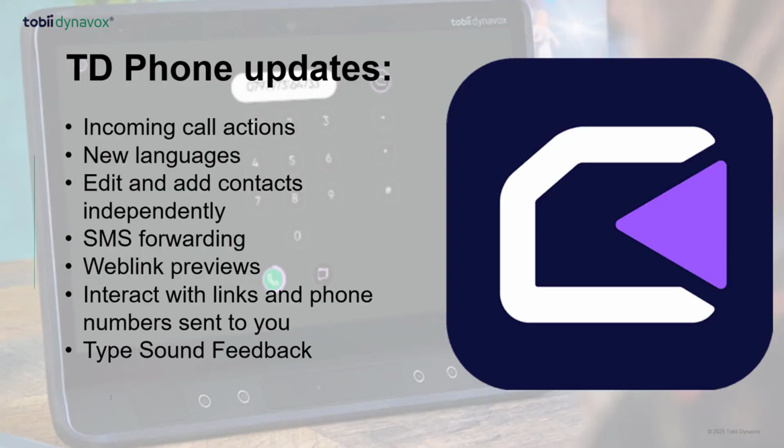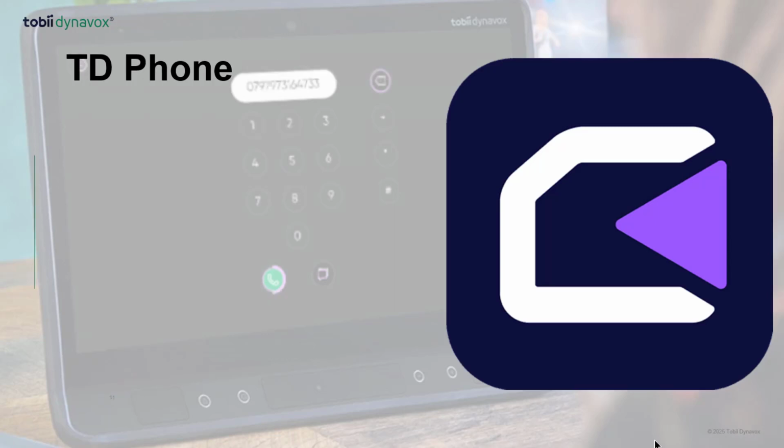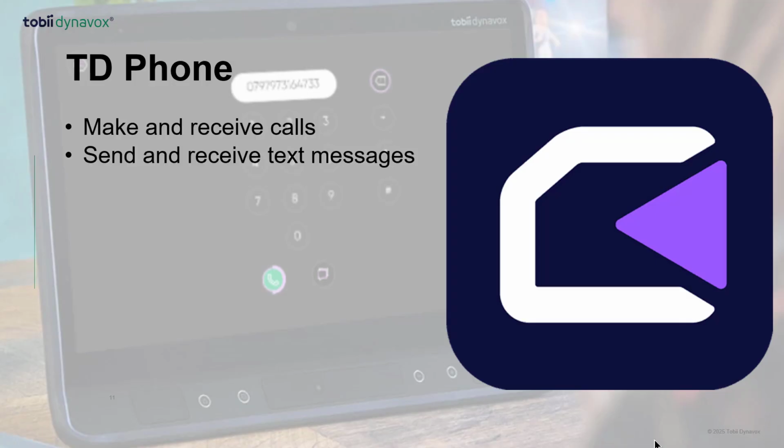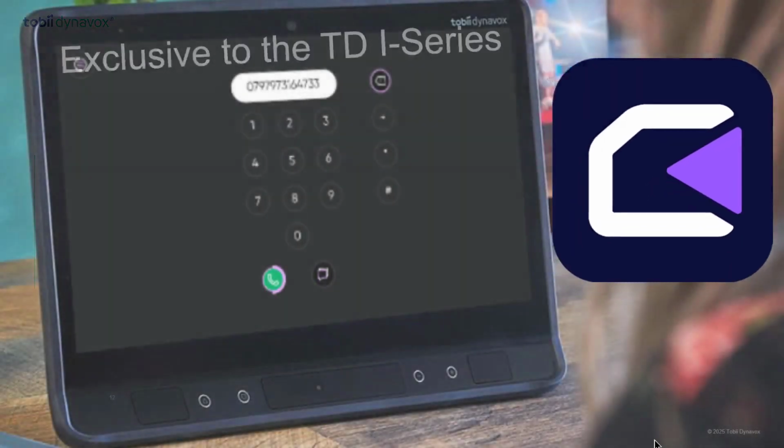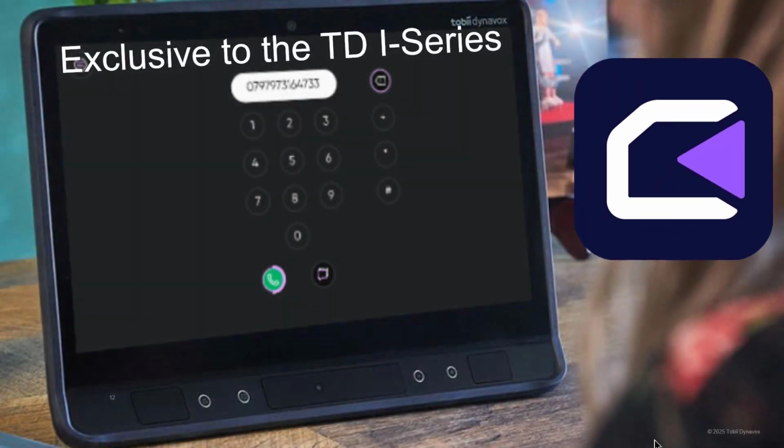Let's start with the exciting updates to TD Phone. To set the scene, TD Phone is the go-to way for eye tracker users to make and receive calls and send and receive text messages from their communication device on their iPhone or Android phones. Exclusive to the TD i-series devices, TD Phone is already packed with great features which make it the most powerful phone utility for AAC users.